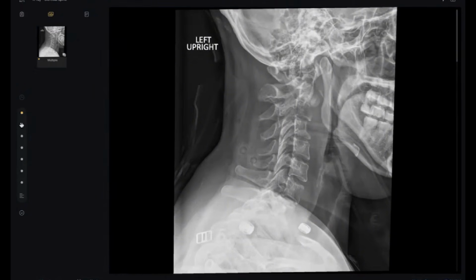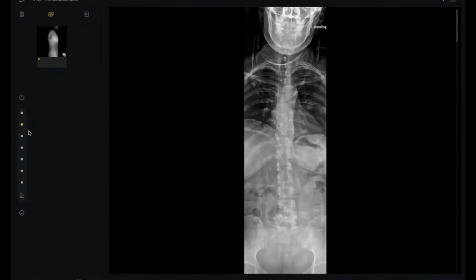Next, the examiner gave you this one, and you did very well. There is a right paravertebral collection here, or at least, if we are not sure whether this is a collection or not, there is widening of the paravertebral stripe, and it looks irregular, so it is a collection.